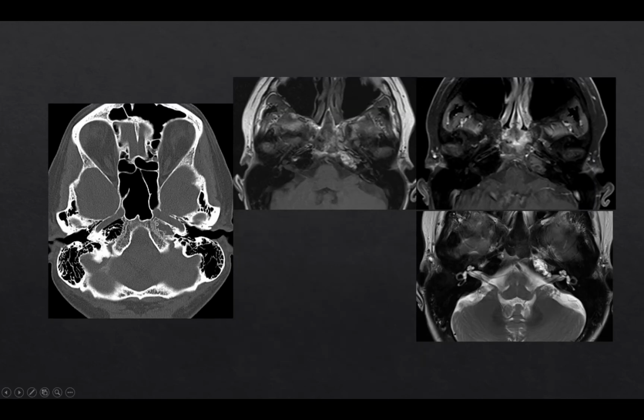In the next case, we have pneumatization of the Petrous apex on the right and an abnormal non-expansile lesion of bone, which is well circumscribed in the left Petrous apex. On MRI, it demonstrates T1 hyperintensity, which suppresses with fat suppression. On T2, it's hyperintense as well. And this is arrested pneumatization in the Petrous apex. This is a developmental finding and is a don't touch lesion.